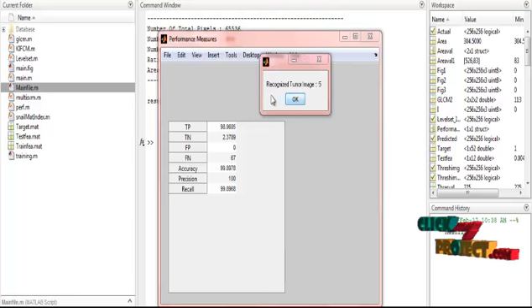Finally, we recognize the tumor image is 5. These are the overall running procedure of the project.